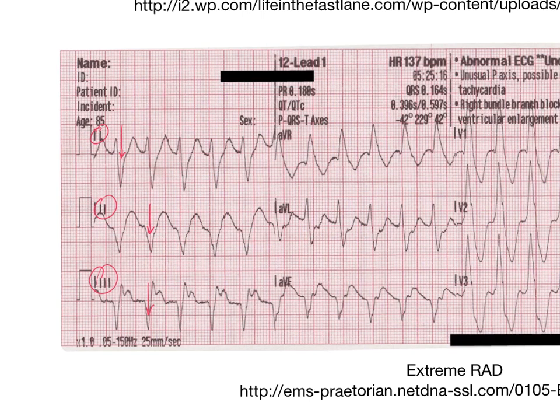Why does it say 229 degrees up in QRS on the axis here? Oh, right here? Because this one, 229 would be, if you look at a clock. Yeah, so the software in this monitor did something funny. Instead of the standard thing that we learned, it converted all that into a circle from 0 to 360, only on the QRS though, because your P and T. Yeah, isn't that weird?